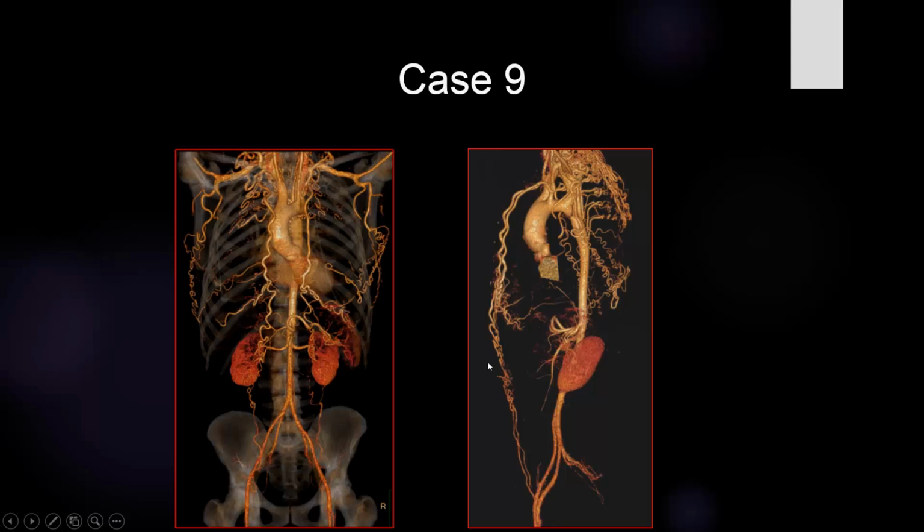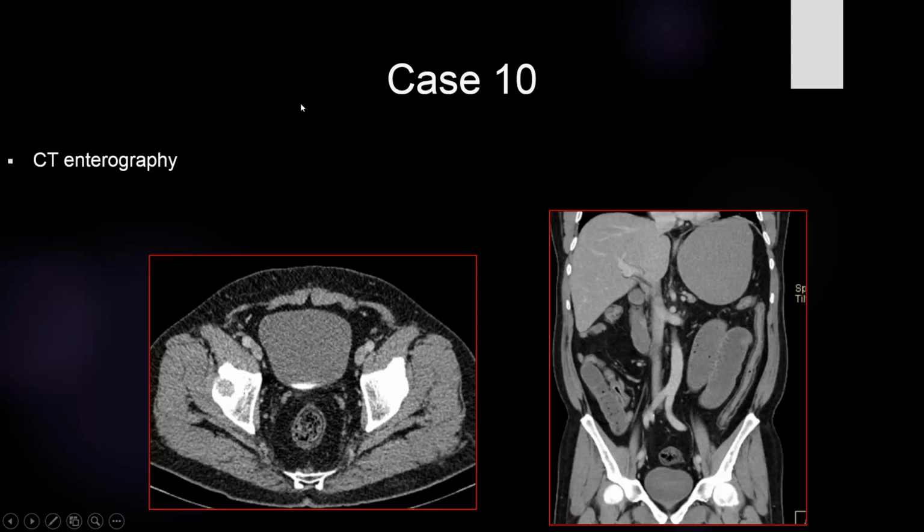So all these features are characteristic of aortic coarctation, true aortic coarctation, due to the presence of multiple chest wall collaterals. And in aortic coarctation there is a tight stricture or tight stenosis at a characteristic site, which is usually the beginning of the descending thoracic aorta, or the distal part of the aortic arch after the origin of the left subclavian.